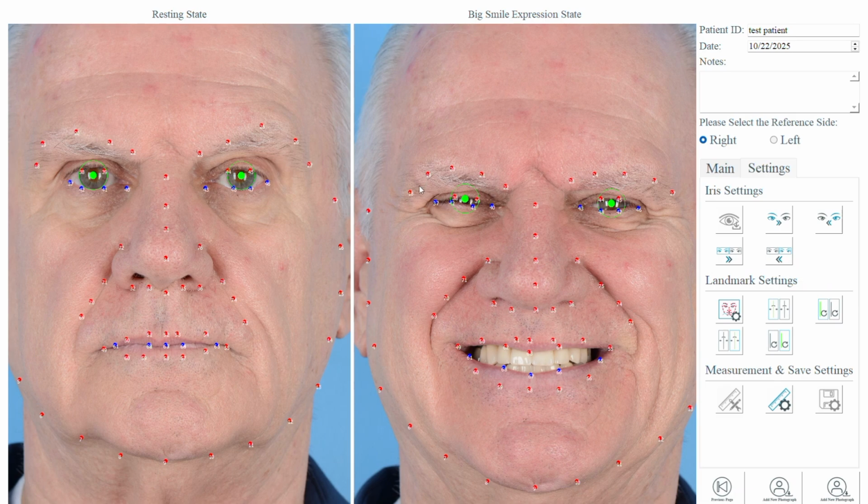This feature is particularly helpful if a patient does not have a wide enough palpebral fissure width for us to visualize a sufficient amount of their iris to adjust the circumference. In cases of severe ocular synkinesis or a partial or complete tarsorrhaphy, this auto-fit feature can be extremely helpful.